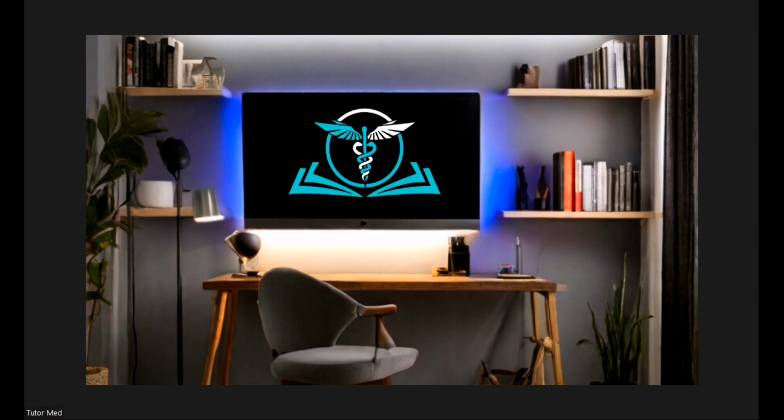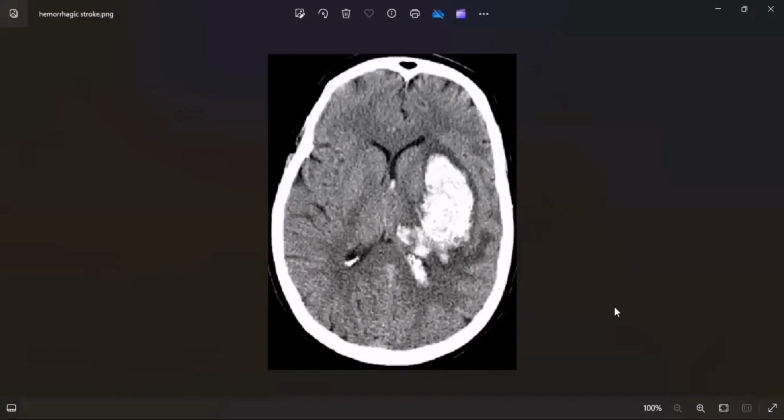Oh, so. Let me see. Hey, I know how to do it. Can you see? Yes, sir. Can you see what is going on here? You see this. How would you describe this? No. I think I've made a mistake.